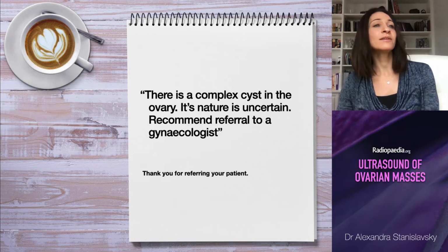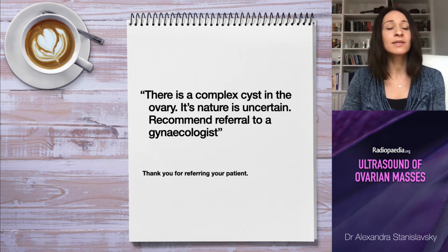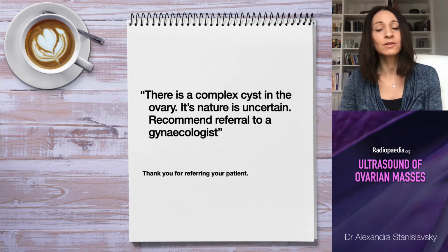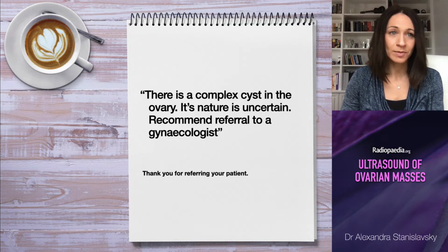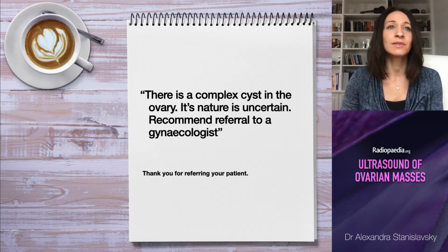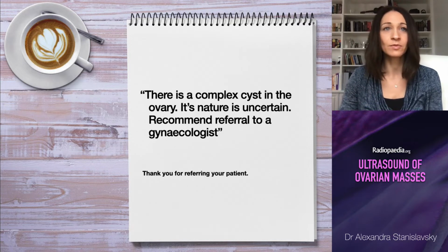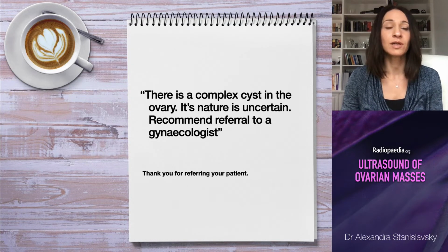My imaginary colleague goes on to say that the nature of the lesion is uncertain and recommends referral to a gynecologist. Now, that may be the right thing to do in some cases. However, if this is in fact a physiologic lesion, such as a hemorrhagic cyst, he may save the patient a lot of stress and money by recommending ultrasound follow-up instead. Alternatively, if the lesion looks like a cystic neoplasm, then he should be suggesting that they see a gynecologic oncologist, because surgical outcomes for malignant tumours have been shown to be significantly better in a patient operated on by a gynae-onc specialist rather than a general gynecologist.